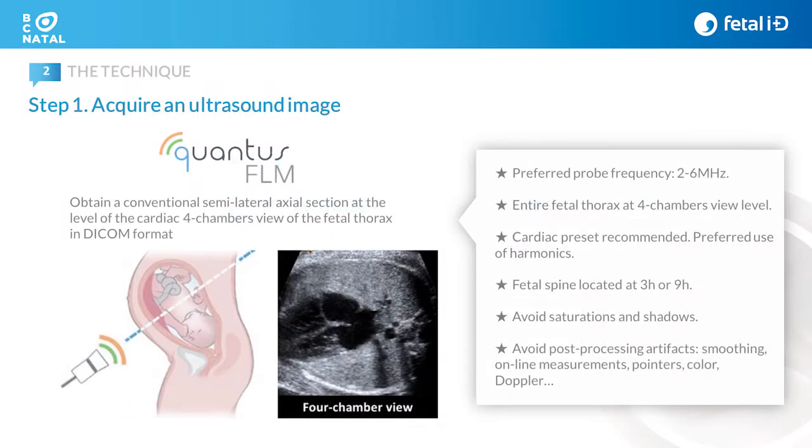Quantus FLM is a software able to determine neonatal respiratory morbidity risk just by analyzing an ultrasound image of fetal lungs. The ultrasound images need some requirements in order to ensure the reproducibility of the technique.